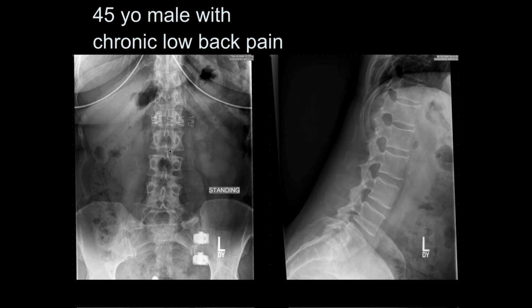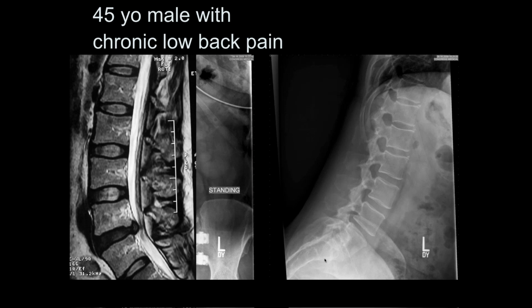Okay, so this is 1, 2, 3, 4. This would be 5. So I guess it's the sacralization of the L5 then. And here, let me see. That's certainly a rib. Is there another one? That's probably the long rib here. So this is probably 12. No, that's probably this. Yeah, I guess there's a rib here, right? So that would be 1, 2, 3, 4. So it looks like there's probably sacralization of L5.